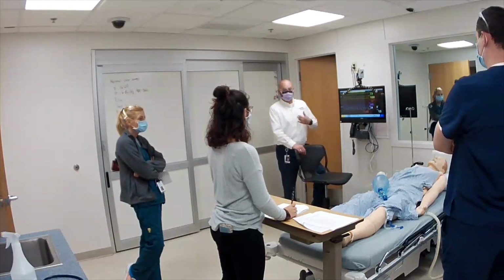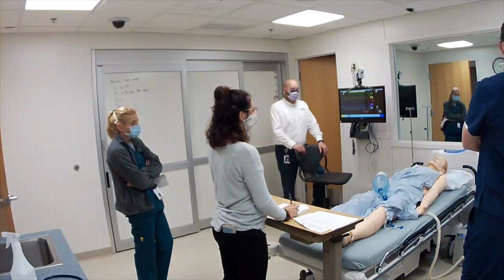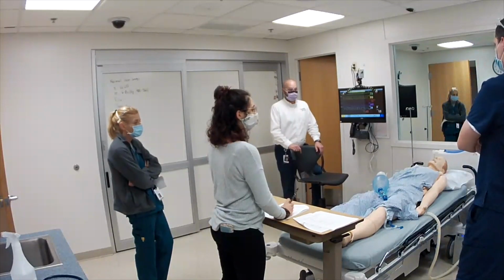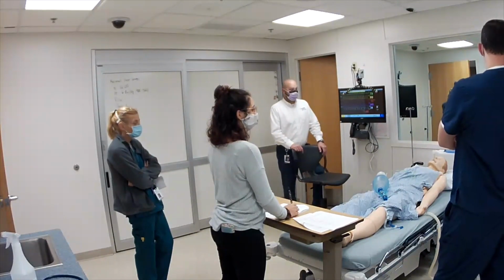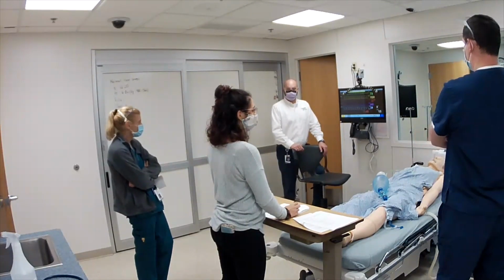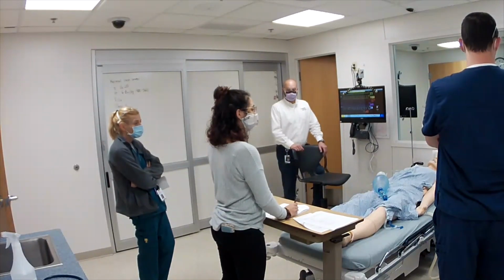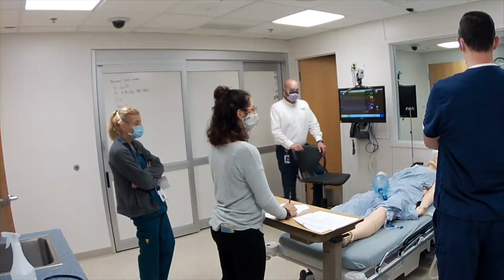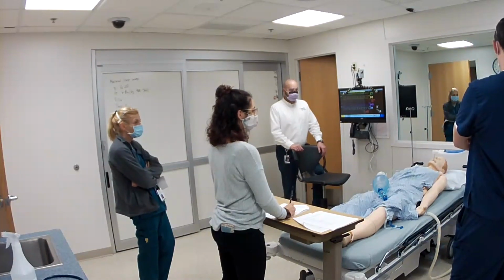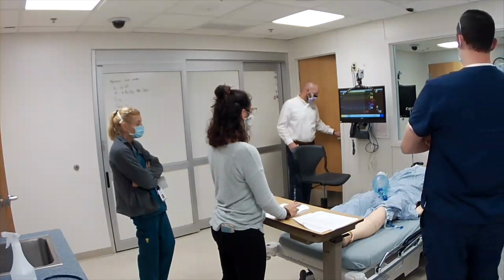Okay. So with that, VTI and VTE, which are the individual tidal volume breaths, right? Okay, so are they the same? They are not. Okay, why shouldn't they be? Why shouldn't they be the same? One, the compliance is not on for the vent for the circuit. So usually we do a tubing compliance to account for the air that's in the circuit. Okay, but that shouldn't change, right? Right. So why are VTI and VTE not the same?